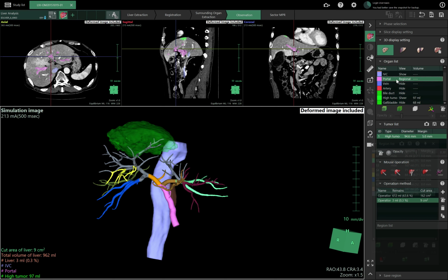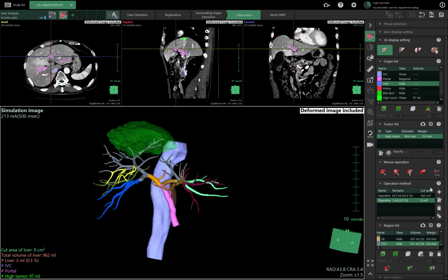So that's fine. Let's go in portal, or not just portal. You can use it in vein or whatever, but if it's hidden, you cannot see it. So this is somehow practical. But there's another one that is this one. Sorry, not that one, I close this.